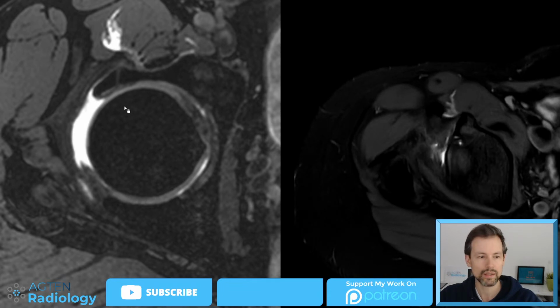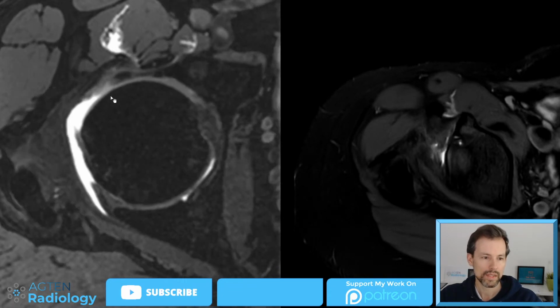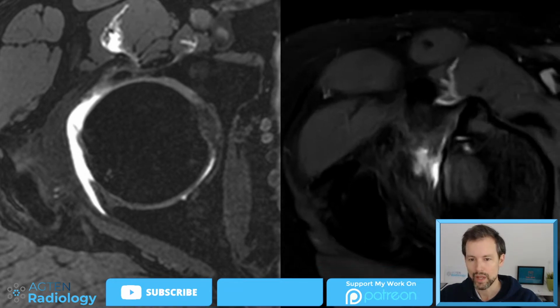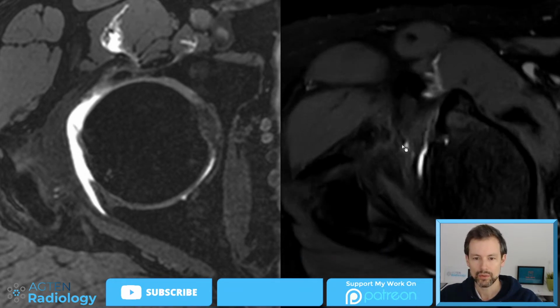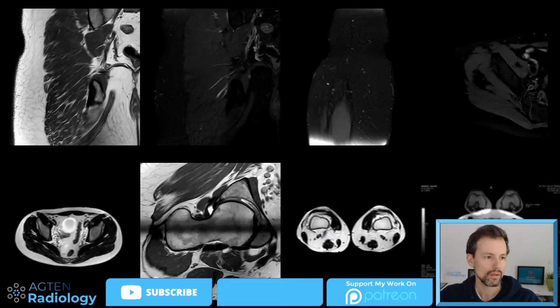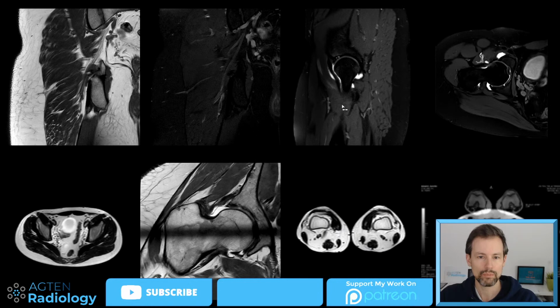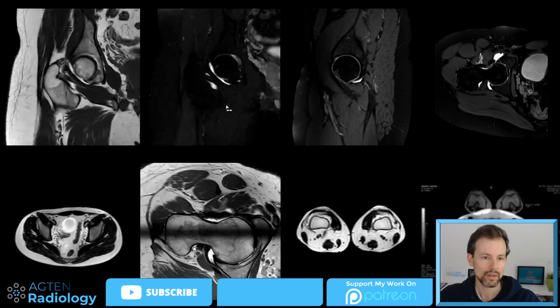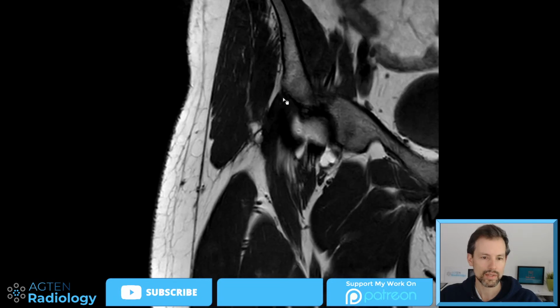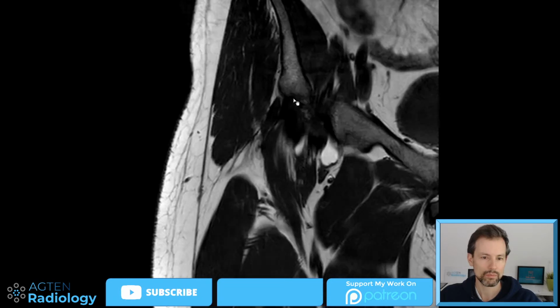So they resected it. The labrum was obviously also a little bit detached, so they used one anchor here to put it back in. And now exactly where they did this kind of surgery, we have this scar tissue there. Now going back to the full post-operative MR again, I think this illustrates this nicely, where we have this complete scar tissue here.